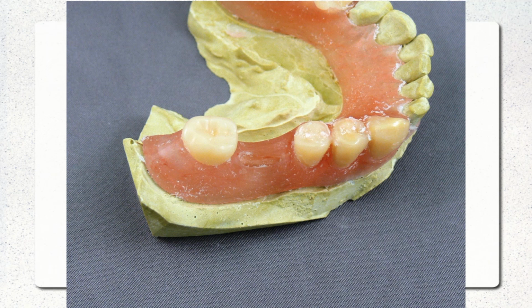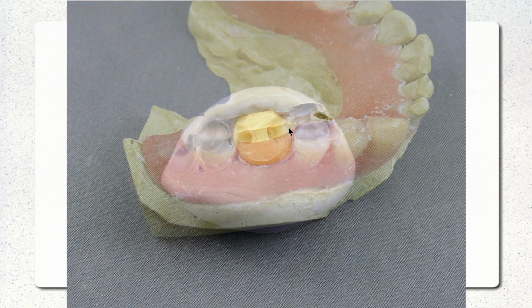And so giving people a general overview of how to repair in different situations, they can then use their own experience and mind to figure out how. So in this case, we're going to add a tooth to this Duraflex. This is going to be with the Hotshot gun. This is a handheld injector, and it allows you to do these repairs super fast, no investing, nothing. So we wax our tooth in place, do a putty matrix, and tack the tooth down in there with a little dab of glue just to keep it from falling out.